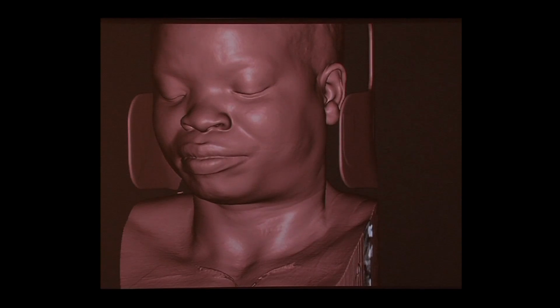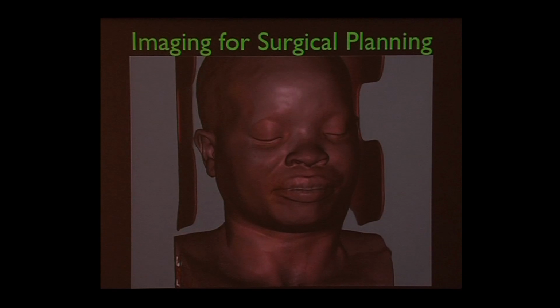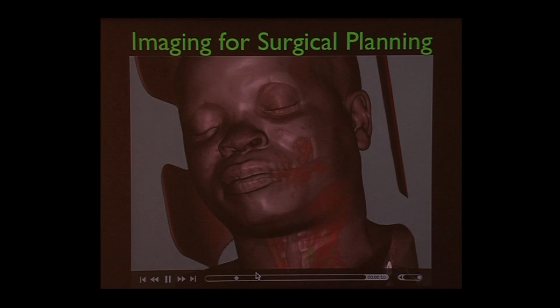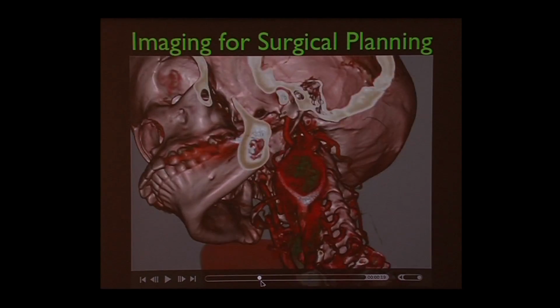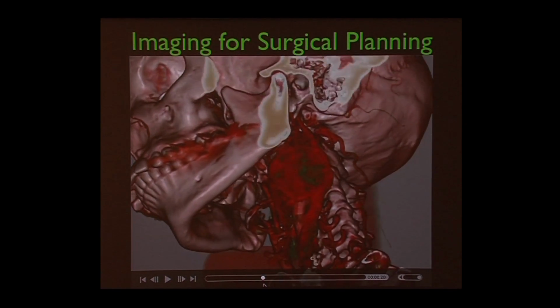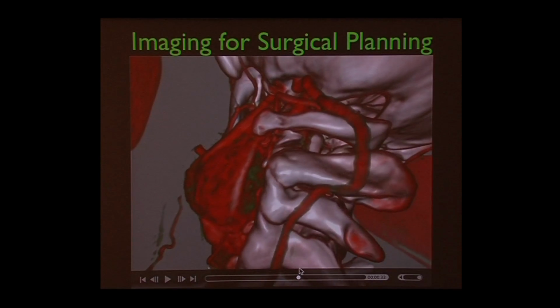So here's a patient that came from Africa, actually, to UCSF, to have this mass taken out. And it's a very complex relationship between the mass and her vessels. So she came here. Here's a movie of, let me just speed through this. But you can see some of the processing we can do here with the 3D image processing technique, the volume rendering. There's her mass, and it's wrapped around her carotid artery. Pretty difficult. And we can continue on and look at the mass from various perspectives and even go into her head.